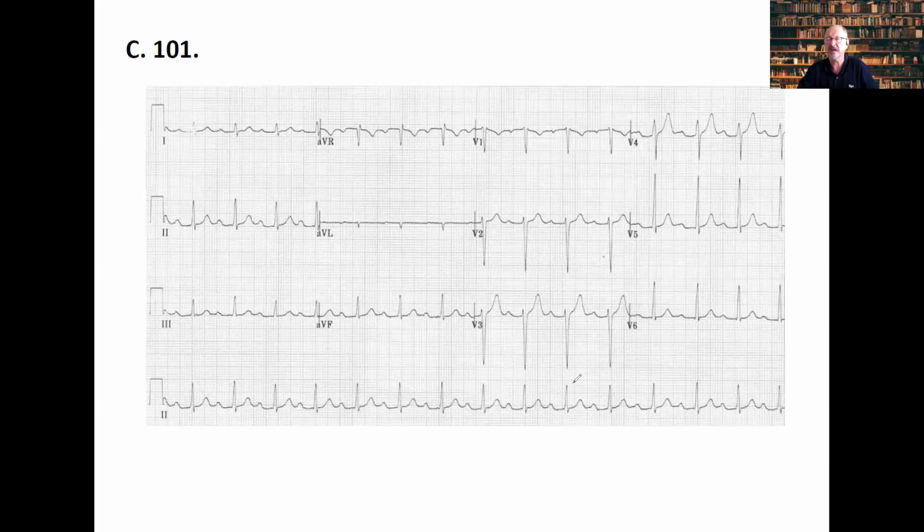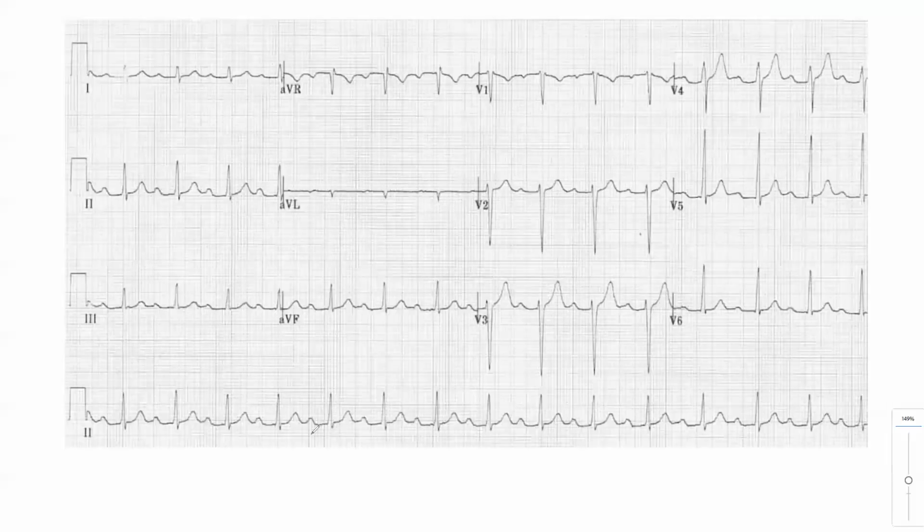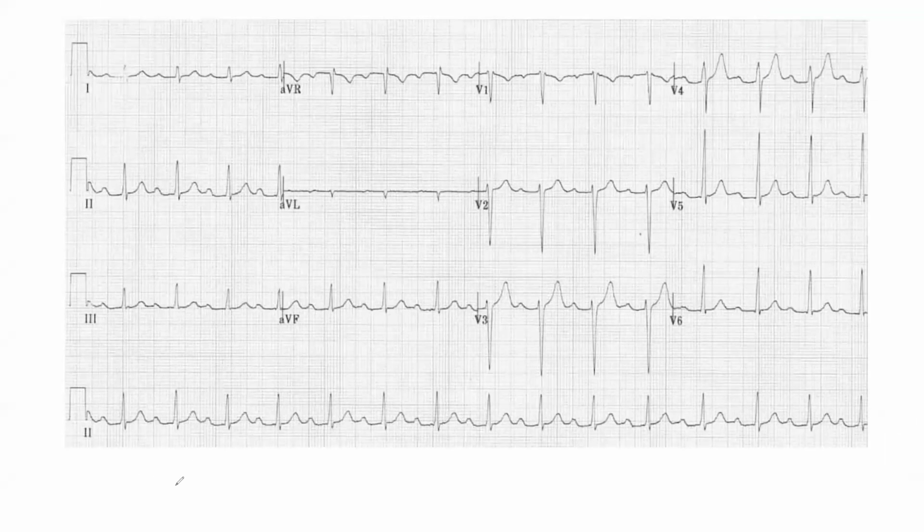The rhythmicity. For the rhythmicity, we look at lead 2 and see whether it's positive. You do see the rhythm strip right here at the bottom. It looks to be positive, and then we look at AVR, and it looks to be negative, so it's a normal sinus rhythm.